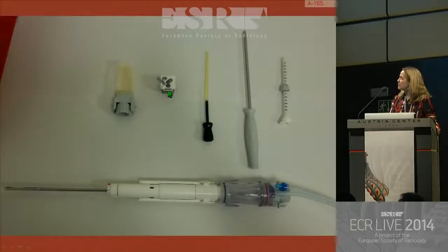Here you have your needle guide block, which sits in one of the squares of the grid, and within the guide block there are a number of holes through which your needle is inserted. This is your coaxial system, where you have your introducer, you have your external sheath with depth gradations and a depth stop, and this is your obturator, and the obturator can be imaged within the breast. This is the needle with a 2 centimetre biopsy chamber, and there's about a 5 millimetre dead space proximal to this. The needle is attached to a basket which collects the specimens, and this is a vacuum-assisted device which is controlled by a foot pump.